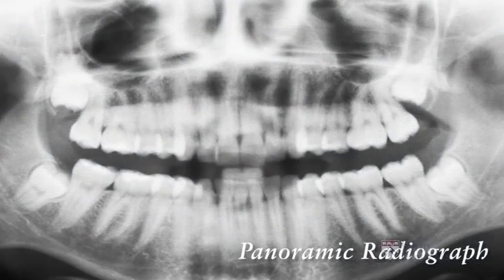Welcome. Previously, we discussed panoramic radiographs for plain film imaging of patients in the context of TMJ arthritic conditions. It is important for clinicians to rule out dental and/or local bone pathology that may cause pain symptoms similar to TMD, and many consider the panoramic radiograph extremely useful for this purpose. Panoramic radiographs are commonly used as baseline imaging for all patients with orofacial pain complaints.